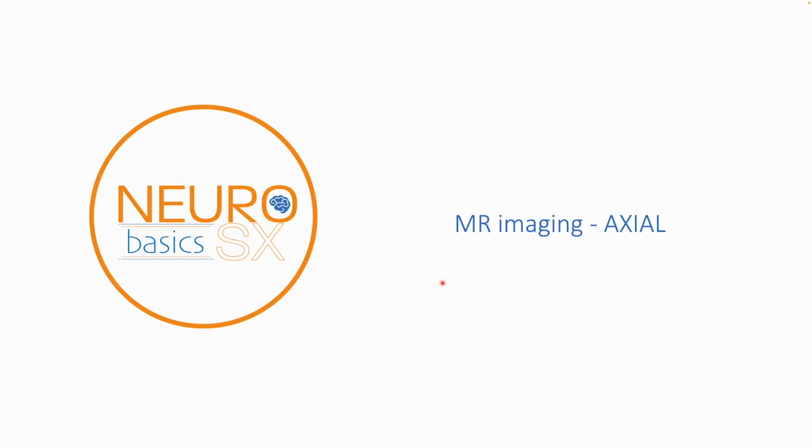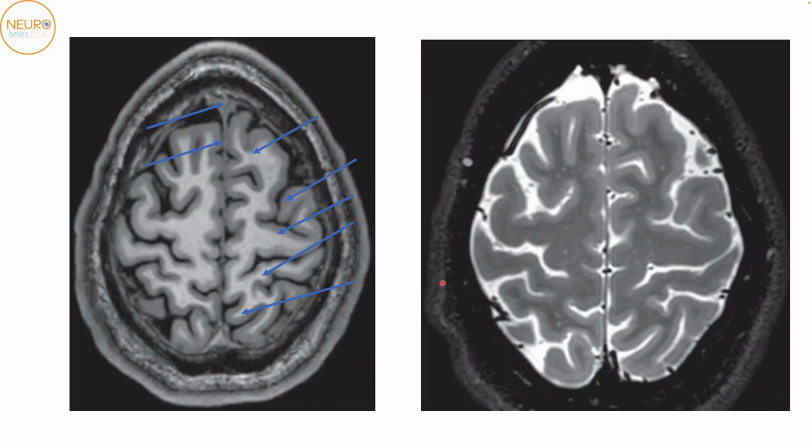Right. So now let's discuss the MR imaging itself and how we can identify the different anatomic structures on axial images. This can be slightly difficult, but if we follow a couple of rules, it's quite easy to identify what we're looking at in most situations. In all of the images in this lecture, the T1 image without contrast will be on the left side, and that's what we're using to describe the anatomy because the anatomy is more clearly seen on T1 images. The T2 images will be on the right side.